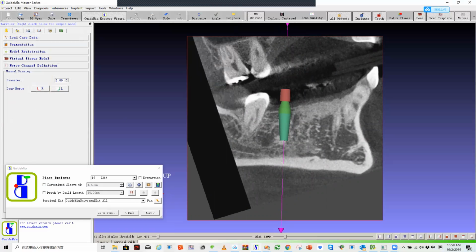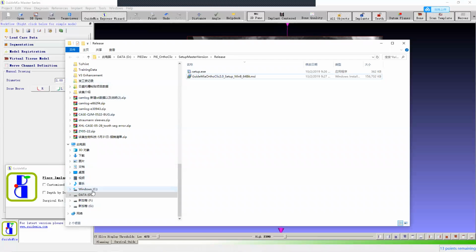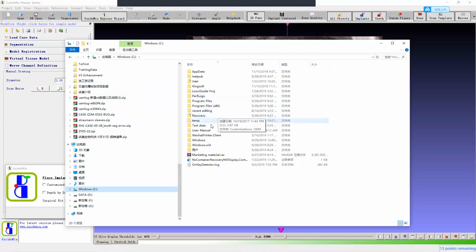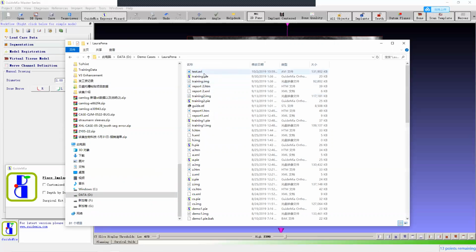Now, let me find where my file is. So this is my video file. This file is pretty big. Typically, we probably want to convert that.